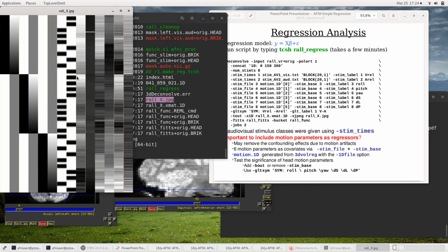So there's a grayscale form of the regression matrix. We've got baseline terms, regressors of interest, and motion. I'm not going to focus on this because I'm not thrilled with this format. But black is big in this case, so it goes smallest to largest. This is the constant term, the linear drift for run 1, constant and linear for run 2, and the same for run 3.